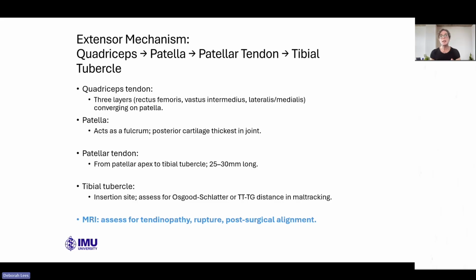But just be aware that you can have different positions of the patella for various reasons, and that can influence the patella stability and put the person at risk of dislocation. Normally it's a lateral dislocation that they have, and along with that you come with an MPFL, or a medial patellofemoral ligament injury, and then it is prone to ongoing dislocation from there.